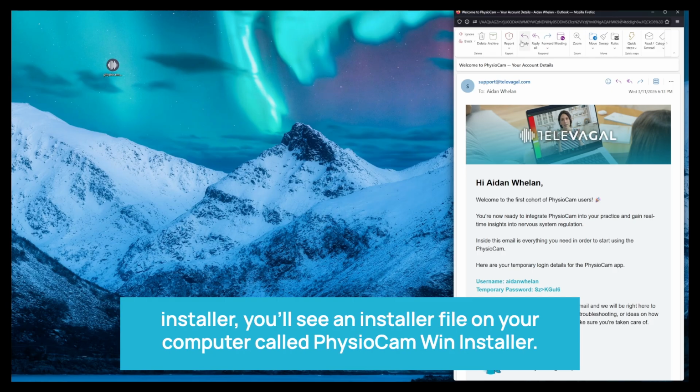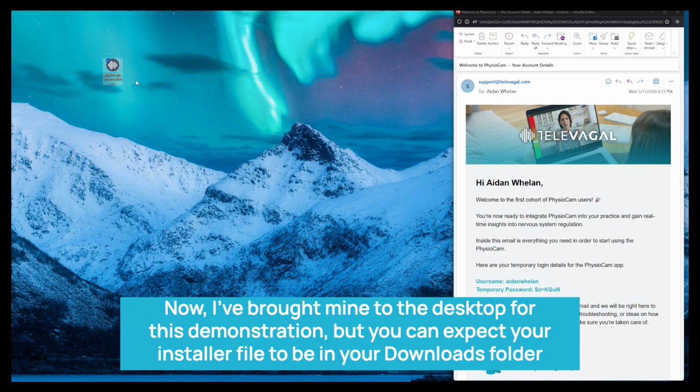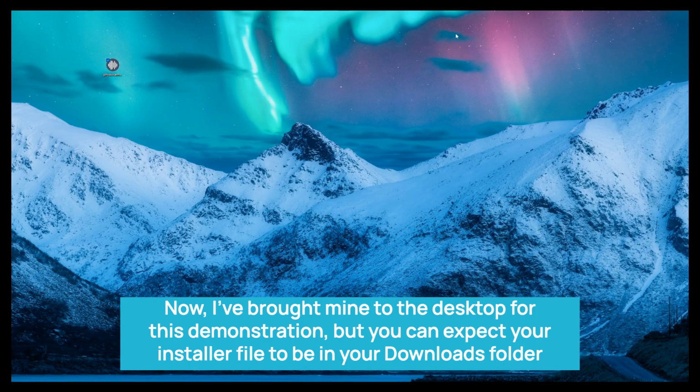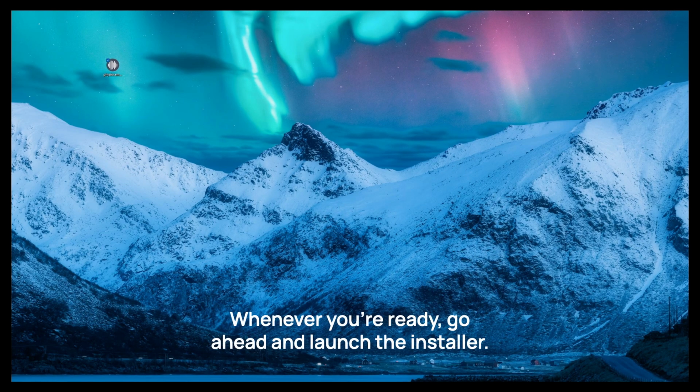We'll use those later to log in, but once you've downloaded the PhysioCam installer, you'll see an installer file on your computer called PhysioCam Win Installer. Now, I've brought mine to the desktop for this demonstration, but you can expect your installer file to be in your Downloads folder. Whenever you're ready, go ahead and launch the installer.